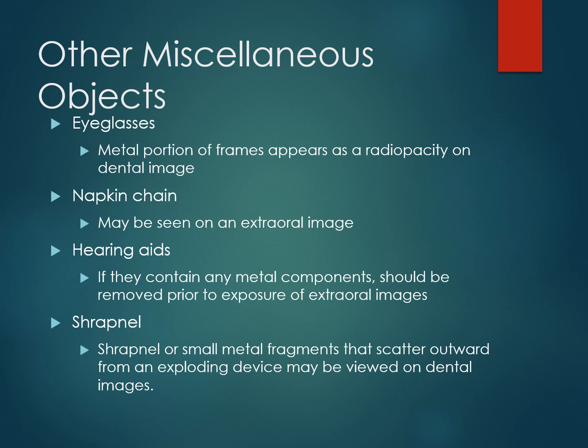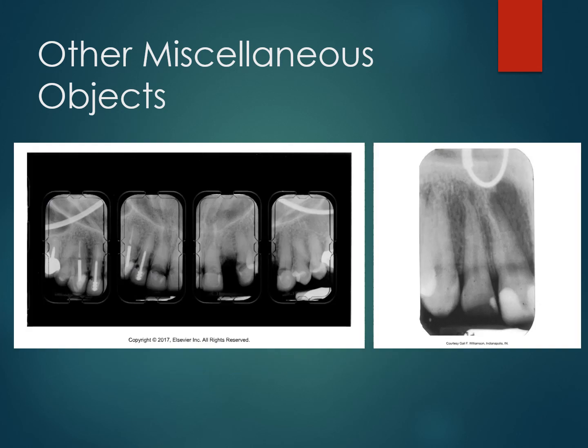They don't need to tell you the story of how they got hurt, or how it came to be there, but they do need to tell you, oh yeah, that's shrapnel. That's what that is. I can't take that out. So you need to have that conversation with your patients, but you need to be mindful that you don't overstep your bounds there. All right, so this one right here, this is our eyeglasses.